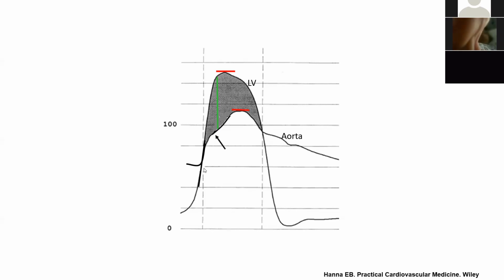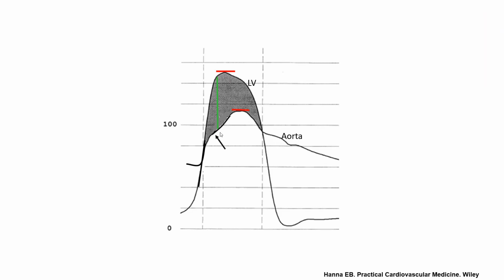Basically, that aortic upstroke starts normally initially, up until the valve hits the opening limit. Let's say it hits 0.8 centimeters squared. After it hits that point, the flow across it becomes very sluggish, and hence the delayed upstroke. That point where the aortic pressure hits the limiting point is called the anacrotic notch. So that point where the aortic pressure bends is called the anacrotic notch.